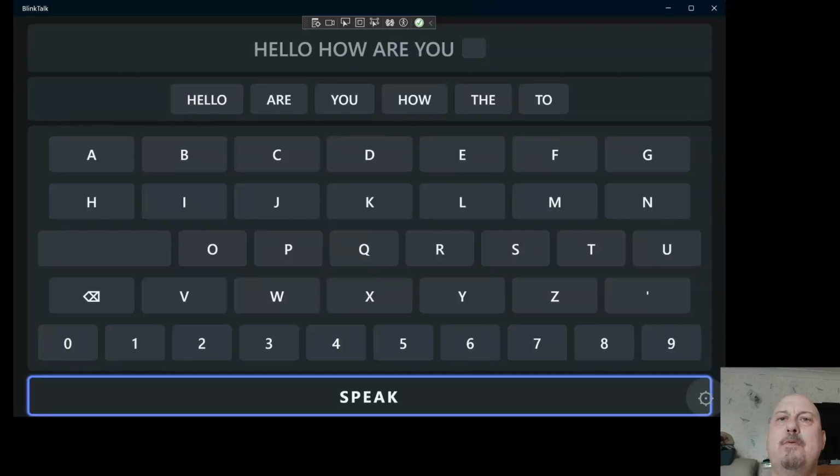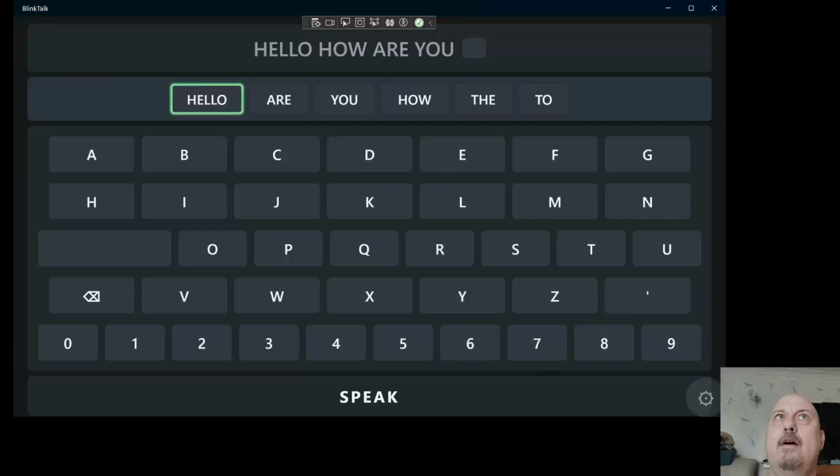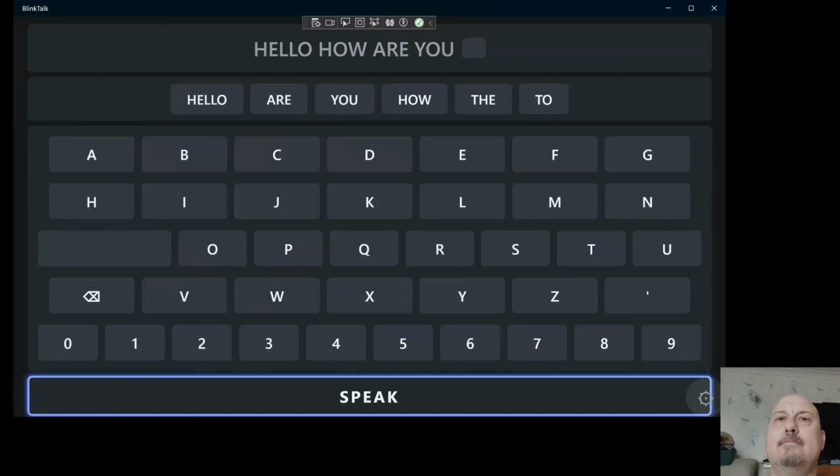So I can choose from the words at the top. Hello, how are you? And you see, suddenly, hello, how are you? Took me less than 2 seconds to type in.